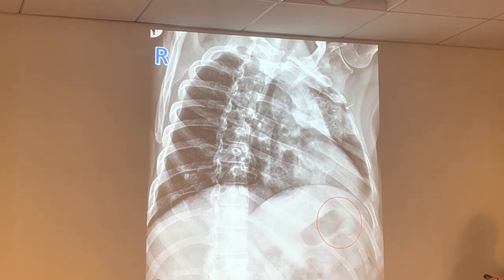So that one, that's an REO. This is an REO because the right side's touching. But when I look at what's elongated, it's the left. So it has to be REO because in REO, I elongate the left side. And the left arm is up. Y'all made it so complicated. I could have just said that. Are we clicking a little more?